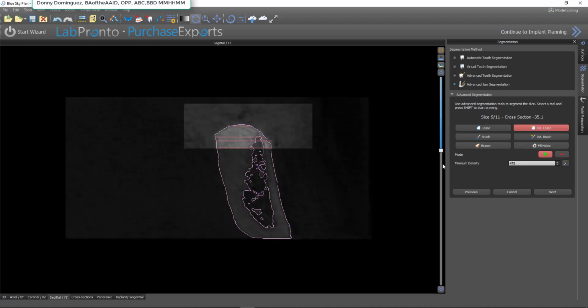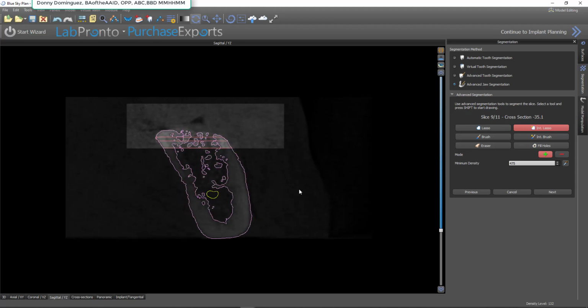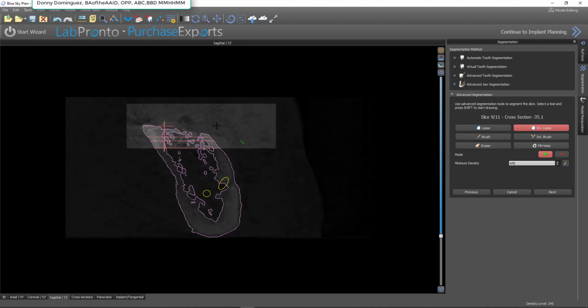And then I'm going to come back this direction. Now don't worry about going excessively beyond here. It may not include that data. You're really focused up here, but I'm not trying to keep absolutely away from this stuff that's not in the highlighted area. Scroll a bit more.